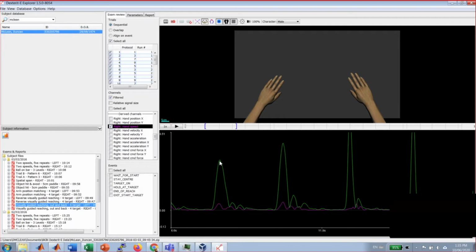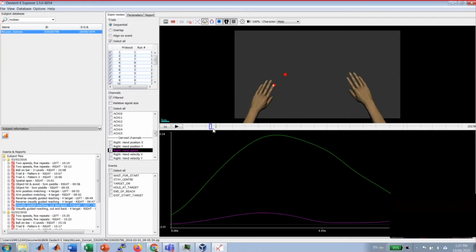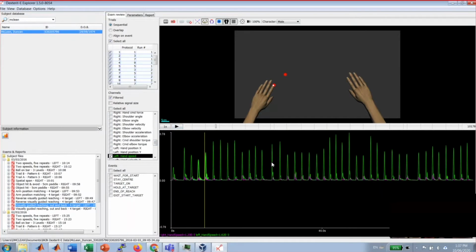Now I've zoomed in, and I can see my hand speeds. See these little blue marks? That's telling you in time where you're zoomed in at in the graph. You can do things like step through. I can step this a kinematic frame at a time and watch things happen if you want. That's a little bit slow to see, but the line is actually moving. When you're playing with this, you can keep zooming into higher and higher levels of detail if you need, and again, this will show you where you're zoomed into. Next, I'm going to zoom back out.